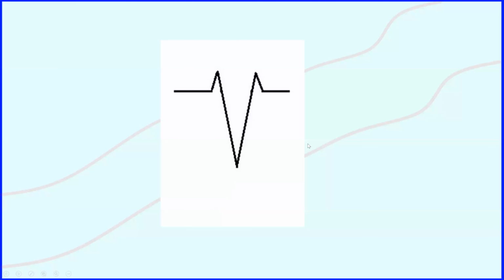And the last thing, guys, what is the name of this QRS complex? Just think about it. Take a good time thinking about it, and please write it in the comments below.